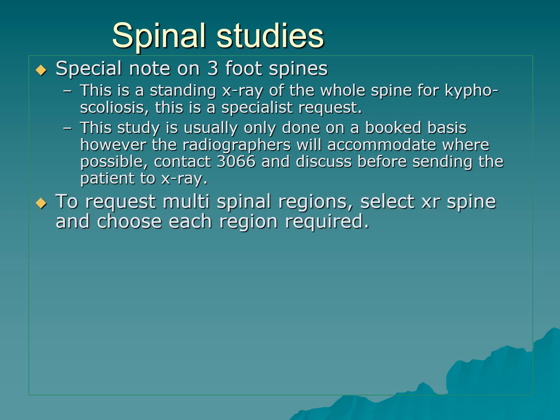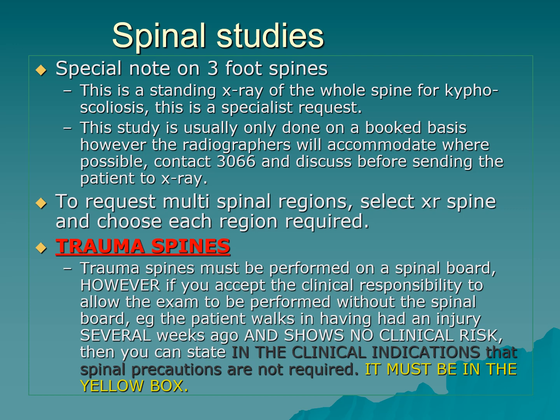To request multispinal regions, for example in the trauma spine, select XR spine and choose each region as required. You may also do this with CT spine. Trauma spines must be performed on a spinal board.